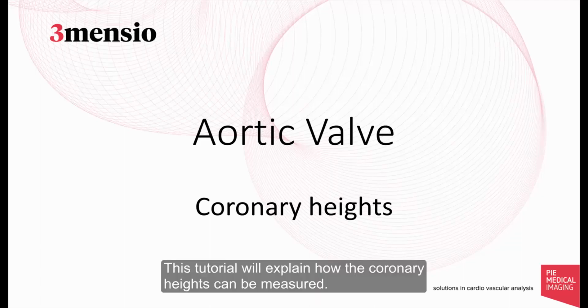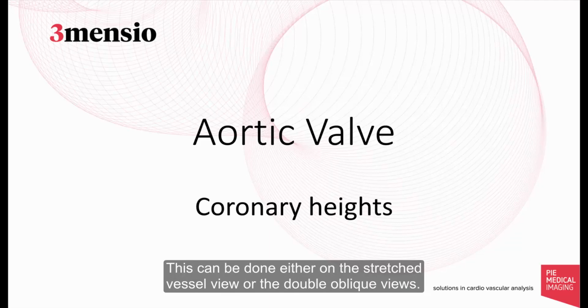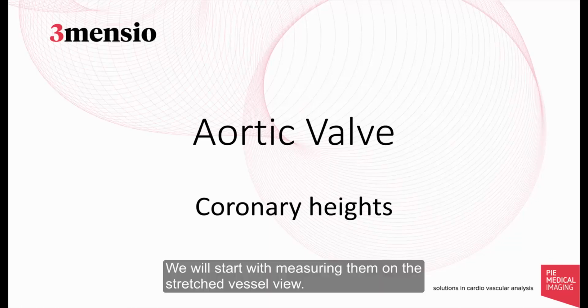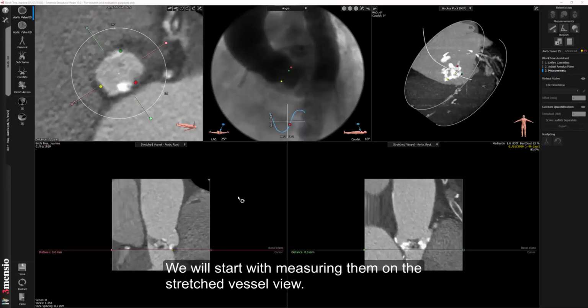This tutorial will explain how the coronary heights can be measured. This can be done either on the stretched vessel view or the double oblique views. Both ways will be explained. We will start with measuring them on the stretched vessel view.